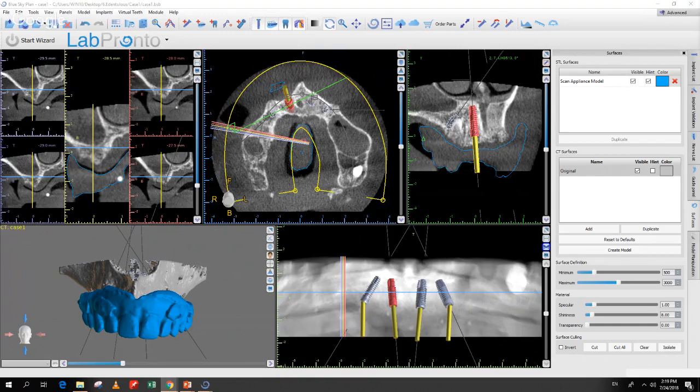Inverting the impression essentially accomplishes the same thing without pouring up the denture and without doing everything that we're going to be discussing. So both of them are good options. We're approaching the same thing from two sides of the same coin. The way we've demonstrated impression inversion until now is one side of the coin, based on the CT scan of the denture, then inverting it. In the next process flow, we're going to demonstrate the triple scan technique, the triple merge technique.